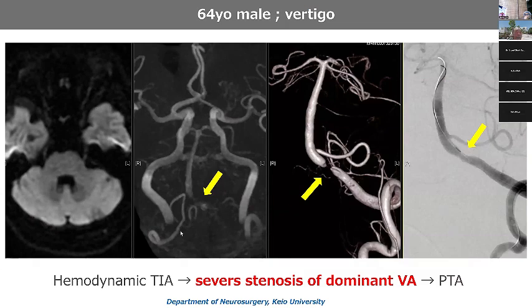This case presented with vertigo, but there is no severe infarction, and MR angiography shows the disappearance of the vertebral artery. The MR angiography does not reveal the stenotic segment, but the 3D angiography clearly shows the stenotic regions. So that's why we need the angiography, and we do a balloon angioplasty to recover this flow.